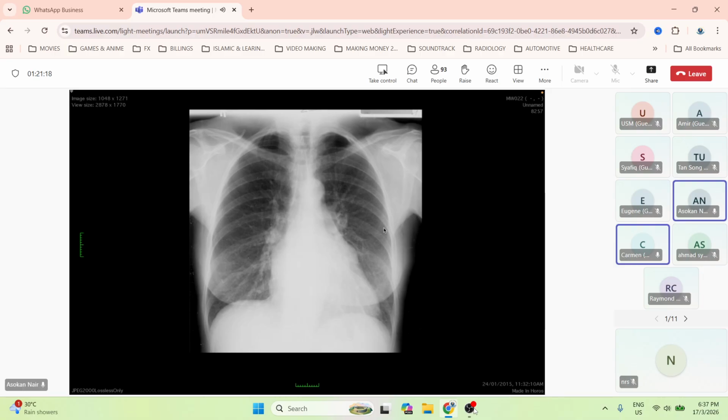And what's the commonest cause of that? For left atrial enlargement, the most common cause in an adult would be mitral stenosis. But is the left ventricle enlarged as well? In this patient, I think yes, because the whole transverse diameter is dilated. So both are enlarged. The left atrium itself wouldn't cause this, so it's mixed mitral valve disease, not just mitral stenosis, there's also mitral regurgitation.